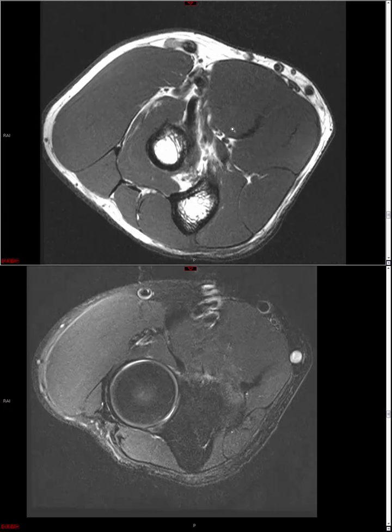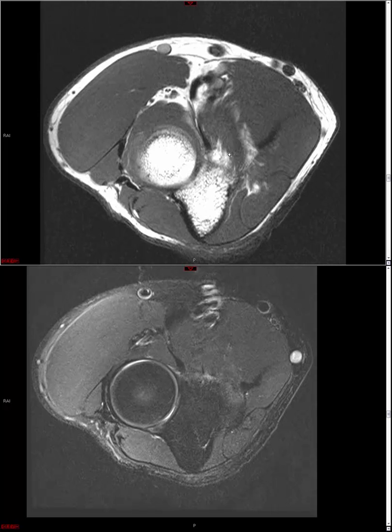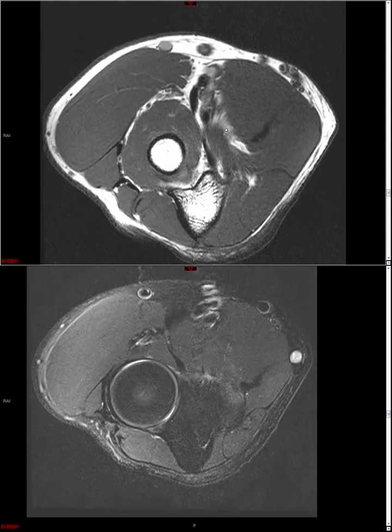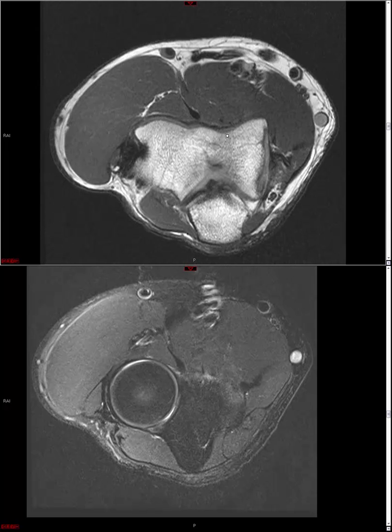And if you look very, very closely, there's actually another slip of muscle that goes deep to this median nerve, and that's actually just the ulnar head of the pronator teres. So the nerve can actually become entrapped between the two heads of the pronator teres, right? But that results in a pain syndrome. There's no motor deficit, so you won't see any other imaging evidence of pronator syndrome, as it's been referred to.